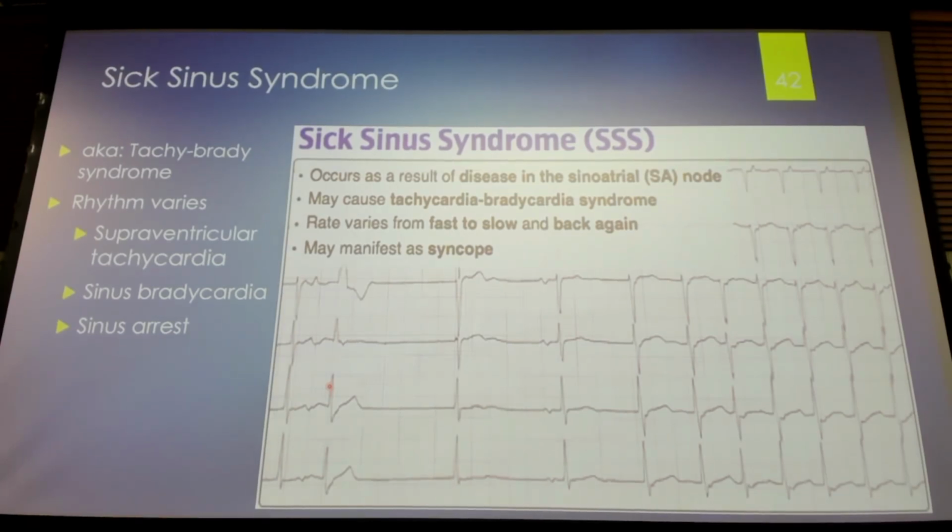For people that have these persistent sinus blocks or sinus arrests, where the SA node is indicating that it is not functioning well, sometimes these patients will have something called sick sinus syndrome. Here, again, the SA node is really giving out. We see this a lot more often in much older folks, but certainly some younger folks can have it as well, depending on their underlying disease process. We'll see episodes of tachycardia and bradycardia, sinus blocks, and sinus arrest, all of those intermixed on one ECG.